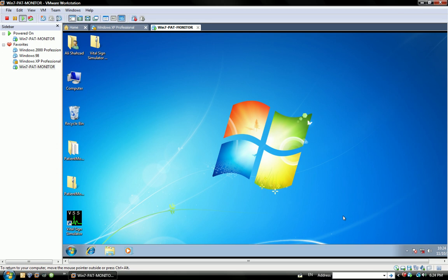This is Art, and in this video I will be showing you how to use the patient monitoring software. This is my second video, and now I'll be showcasing the vital signs simulator software for you all.